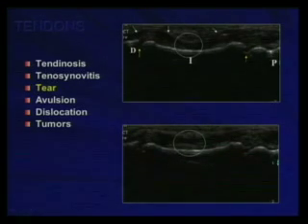So this is sagittal view. You can see here the proximal phalanx, PIP, middle phalanx, DIP, and distal phalanx. This is the FDP coming there. Appears in continuity, right? But it's too close to the bone. This is the normal side, and you can see here the FDS, PIP, DIP, and the FDP attaching the distal phalanx.